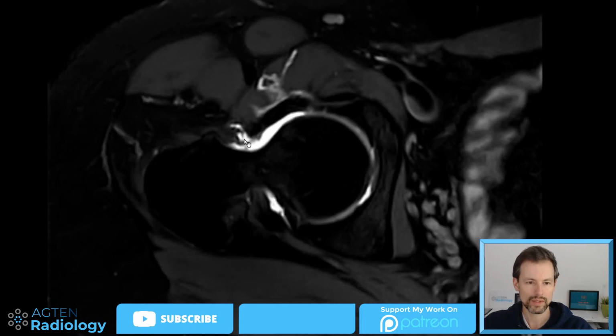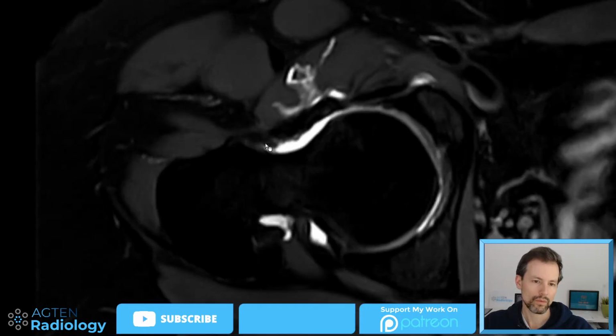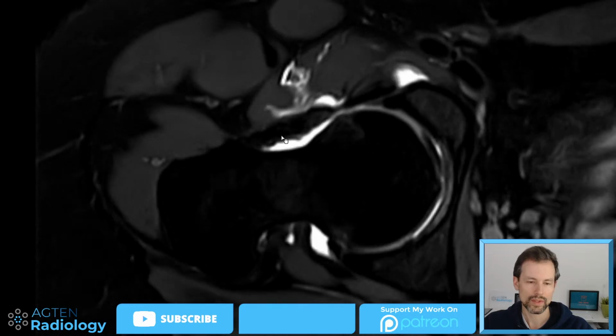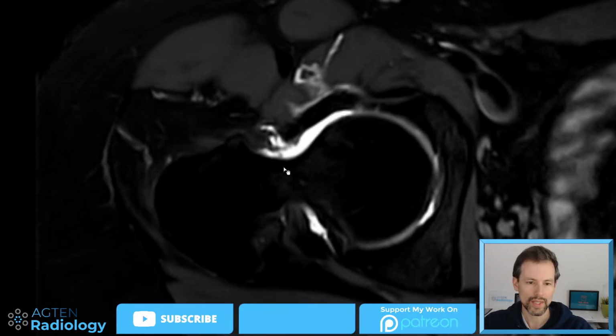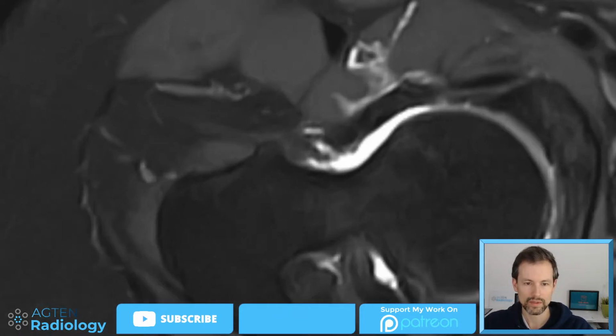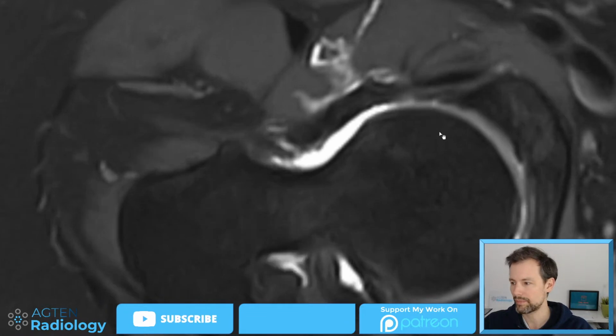So here, there is still in this ventrocranial portion a gap of the joint capsule, whereas more caudally or distally it's still intact. So now they went on and said that there are some small adhesions that they released. So we try now to identify these adhesions on this oblique image here.